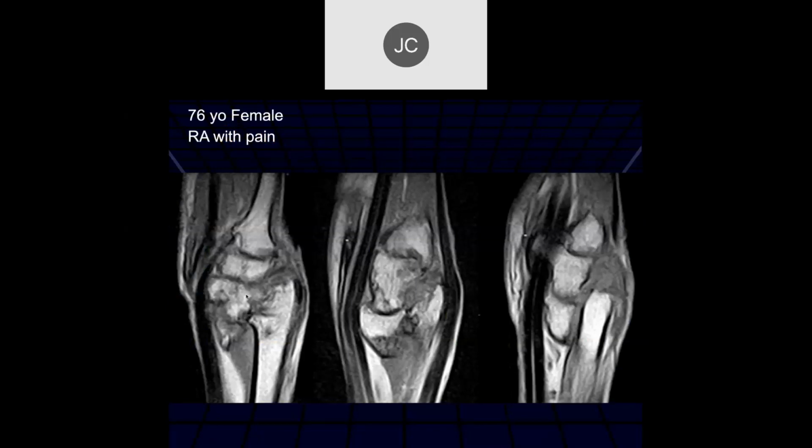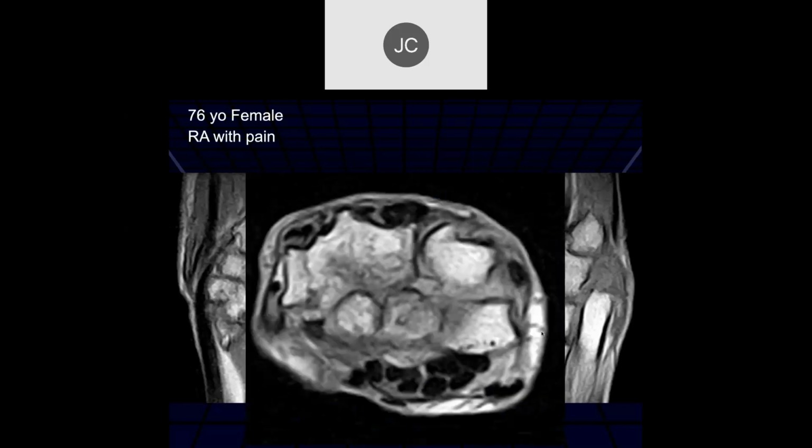Okay. Now, this can also occur more proximally. Here is the wrist, where we have destruction of the radial ulnar carpal joint space. And here you can see volar subluxation of the whole carpal bones with proximal migration in long-standing rheumatoid arthritis. Another deformity which leads to very poor function of the wrist, as you can imagine.